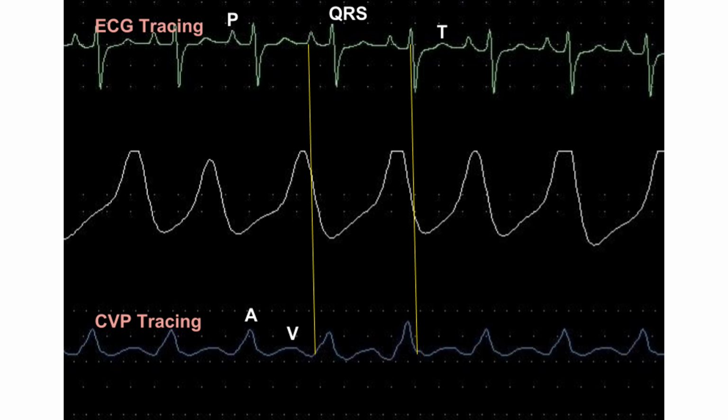Mean central venous pressure is calculated by electronic averaging of the waveform and displayed on the monitor. It is the mean central venous pressure which is considered for guiding fluid therapy rather than the waveform. Waveform is mainly used as clinical diagnostic clues while assessing the jugular venous pulse.